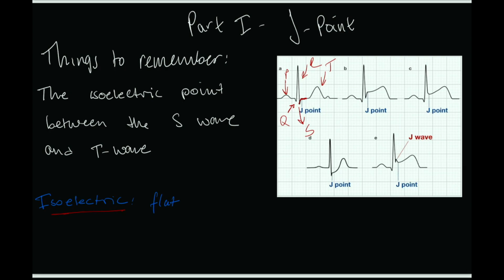We see even further in example B that we again have a P wave. We have that positive deflection making that our R wave. Before the R wave we do have this negative deflection, which is our Q wave. But we'll notice that after the R wave and before the T wave, nothing goes below the isoelectric point, so there's no S wave. But we know where the S wave should be.